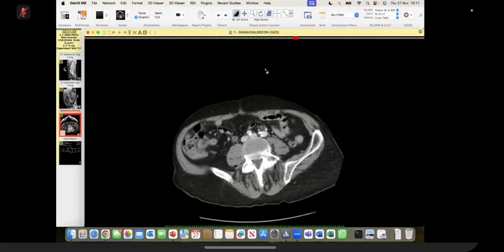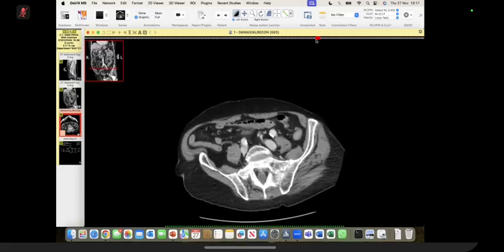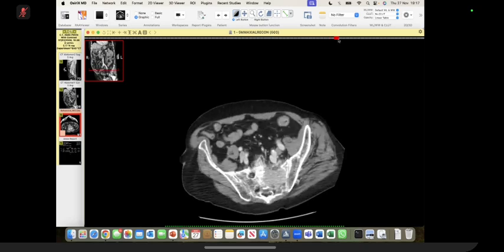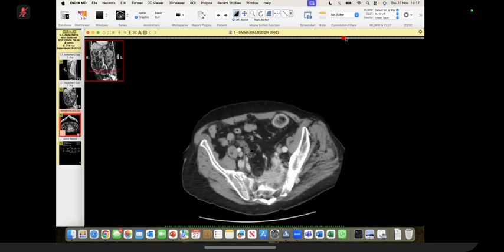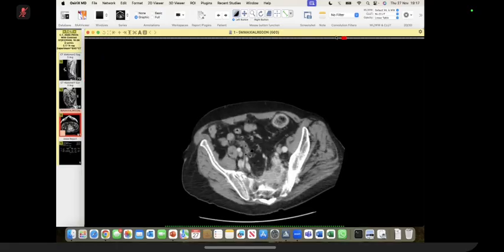Okay, go for it. You've got the CT with you. Just go for the sacrum. Okay, I'm provided with CT scan axial slices of an 84-year-old adult male patient who has presented with. Okay, sir, I can see that. Give me your diagnosis. Sorry, sir. Just conclude the case.